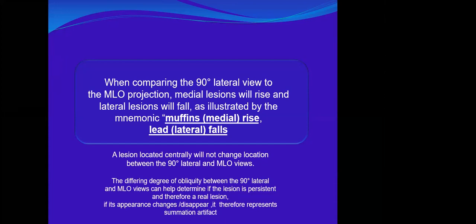Quickly, we want to go through the rest of the examples. Are you following, all of you? Can you repeat the question? Yes, doctor. Tomosynthesis? Yes, tomosynthesis.